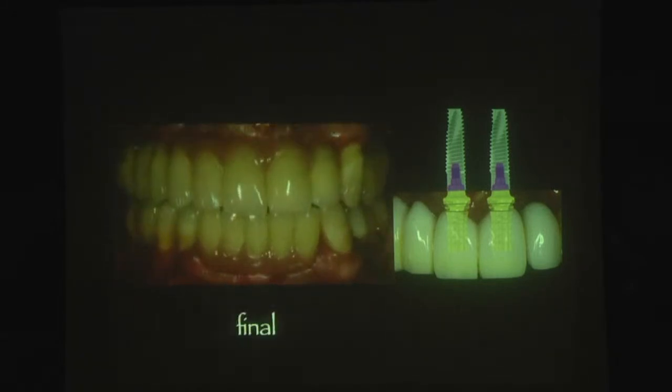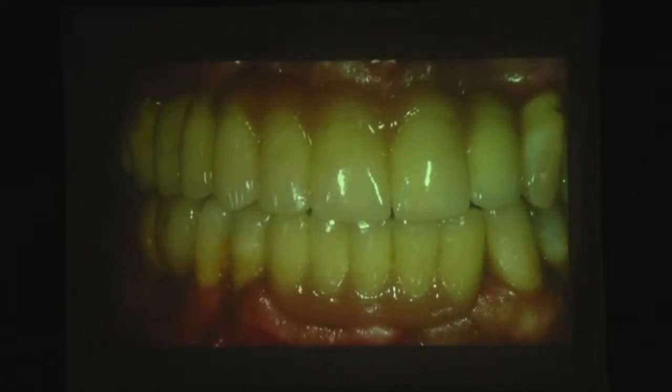And finally, we tried to find the best color, which must not be white all the time. If it is a little bit brown, then we have to act like brown. So we finalize it with porcelain fused metal and having some pink porcelain to tolerate the missing soft tissue parts. So the job was done as planned.